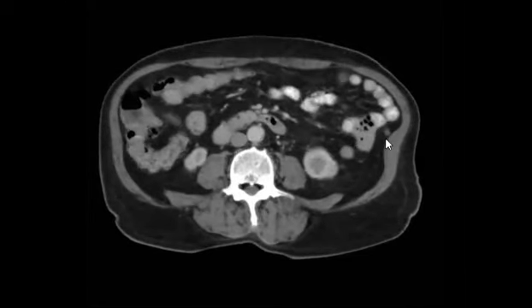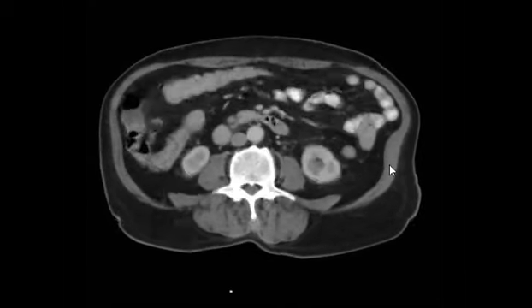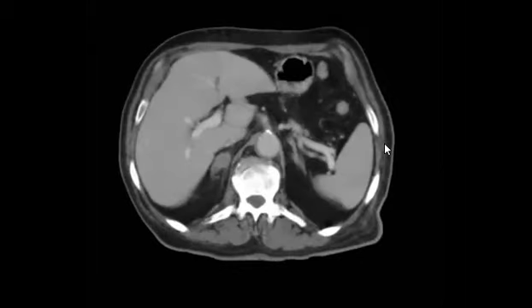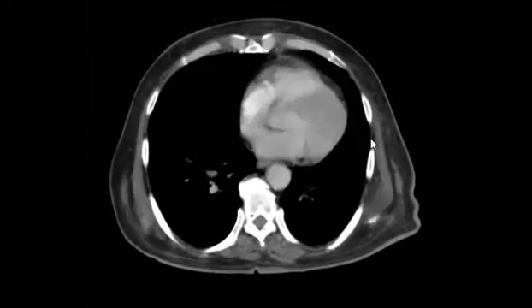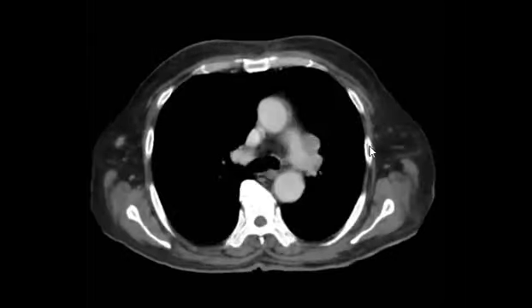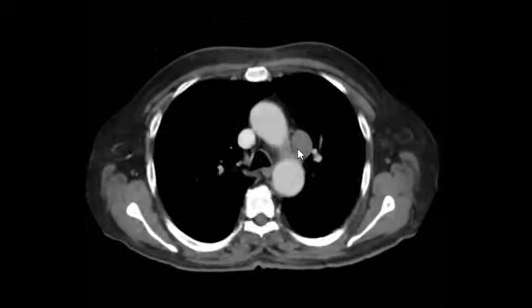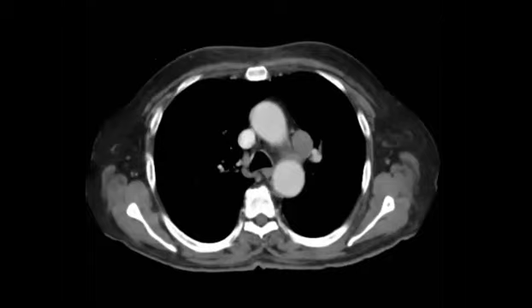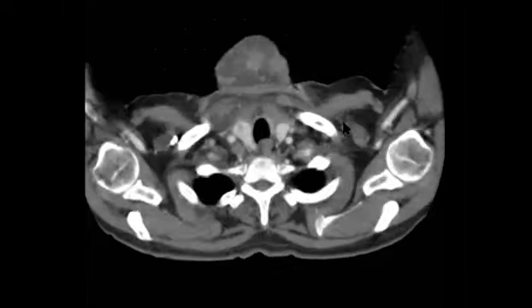Can you see it? Very small, maybe something peritoneal, a nodule, maybe metastasis. This type of case comes to you, and you should report everything, because this patient probably, if he's metastatic, as we see, will take chemotherapy and we need follow-up. And I saw that many of you already mentioned the prevascular lymphadenopathy. It's very nice from you. Thank you. So it is a nice case, with many findings.